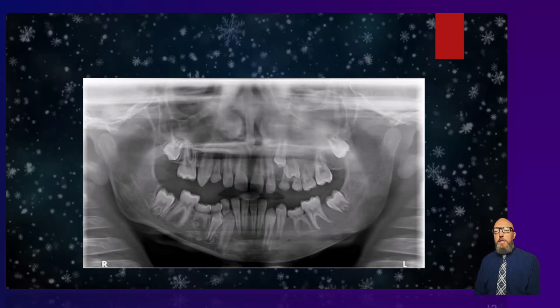So take a minute to look at this and what's going on. First of all, do you see where the lesion is, or lesions, I should say? Maybe this one stands out in the mandible, very ground glass appearance of the mandible. And if that ill-defined ground glass nature makes you think fibrous dysplasia, good, you're right on. But is that the only area of a lesion? Compare the two sinuses. And the left one is largely obstructed. Where's that sinus border? That again has that same ground glass appearance. And so this is two different bones that look like fibrous dysplasia.